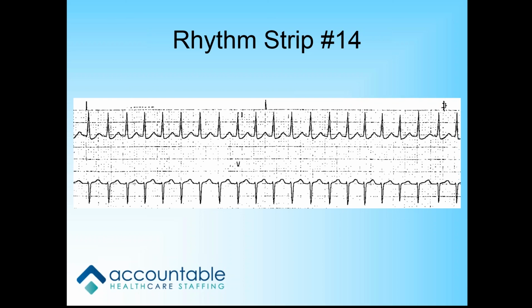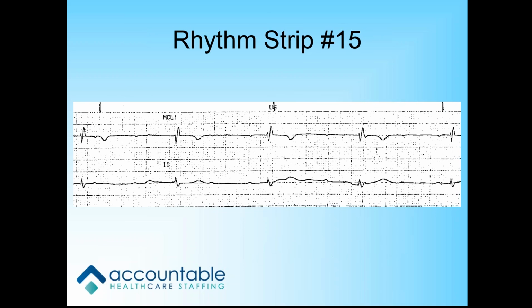Okay, next. So on this one, they were able to do some really fancy diagnosing, and they got to atrial flutter, but we're sticking with SVT. Okay. Good job. Thank you. Kristen, next.